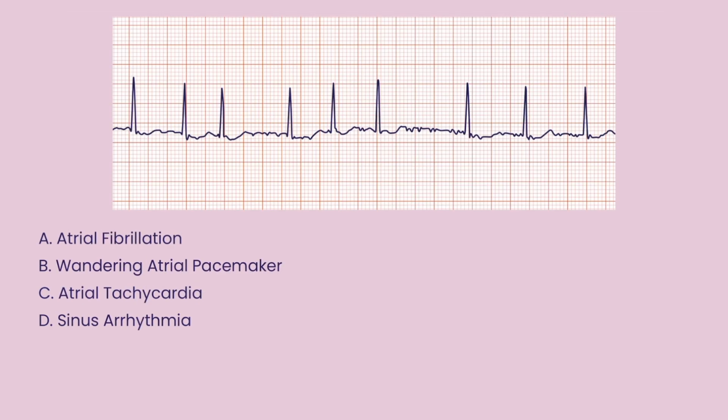All right, what jumps out? You should see that these guys here are close together. These are farther apart, and this is chaotic. What does that tell you? Atrial fibrillation. QRS is narrow. We have a chaotic waveform. No P waves are present, and it is irregular rhythm.